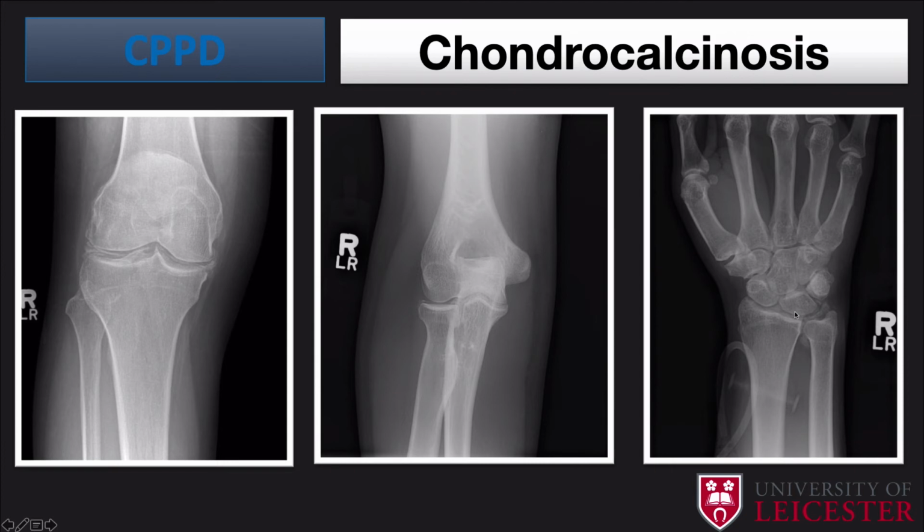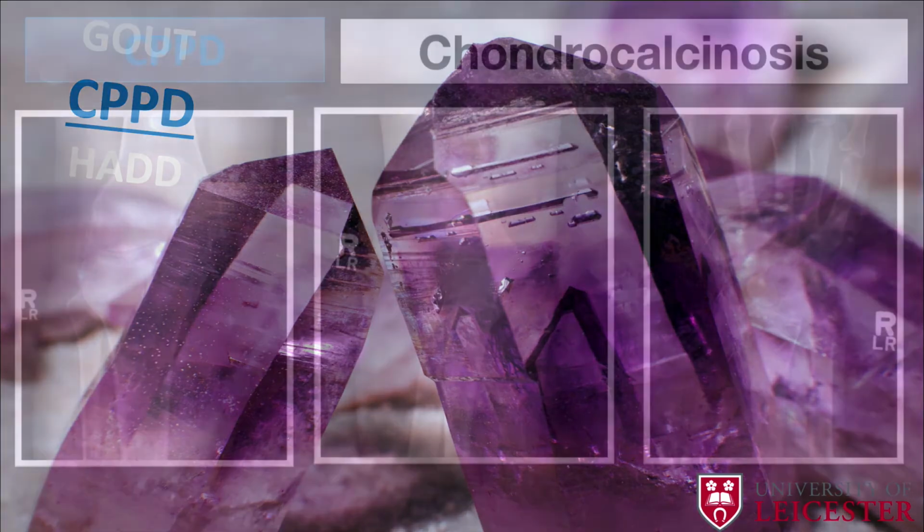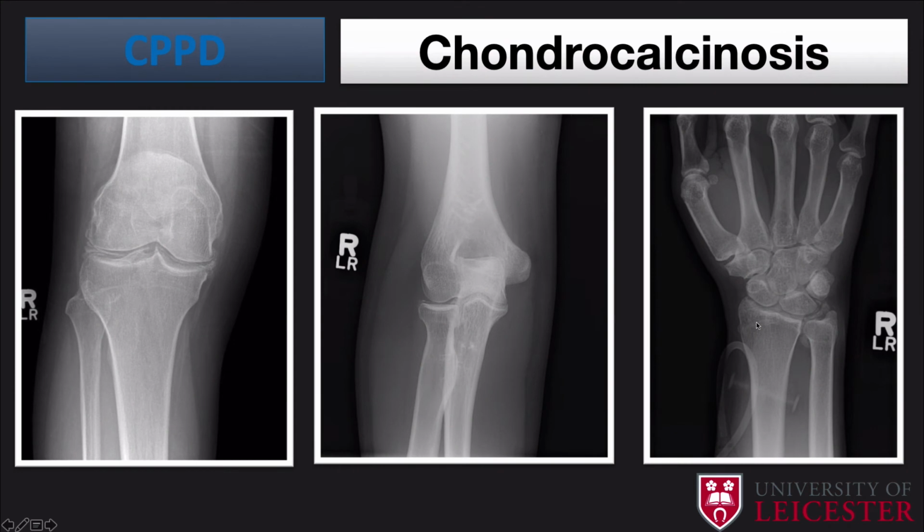And here within the wrist, again an example of hyaline cartilage, but you've got all this extensive chondrocalcinosis. This cartilage here we call the triangular fibrocartilage complex, and you can get this deposition present in that area. So you can see all this deposition just present here. You've also got a bit of cartilage deposition within the distal radioulnar joint adjacent to the synovium.